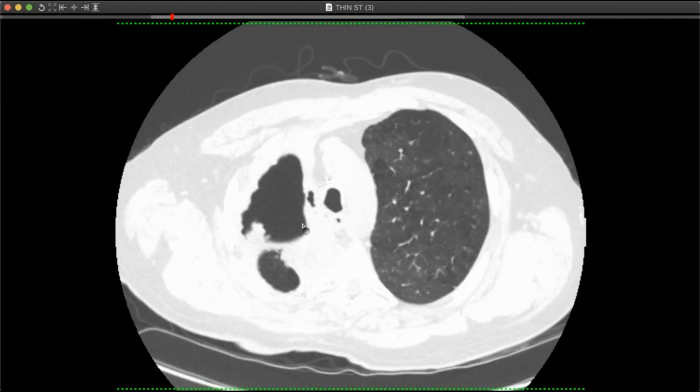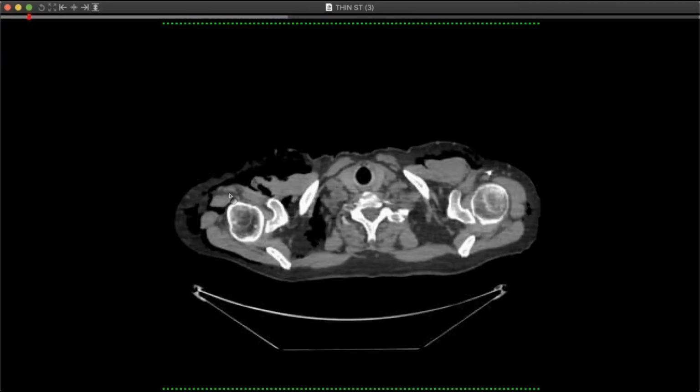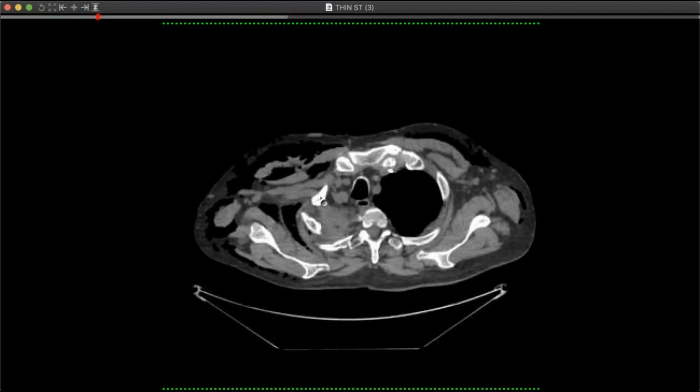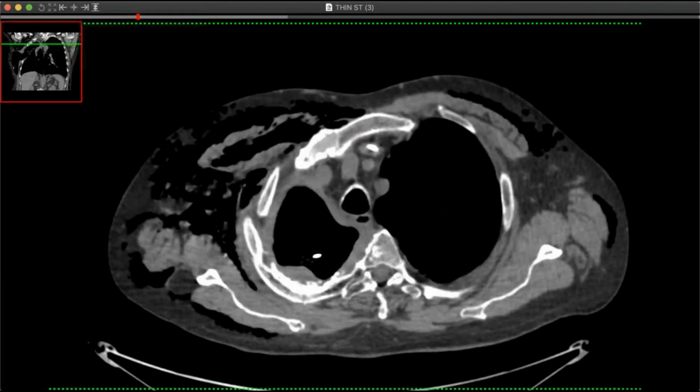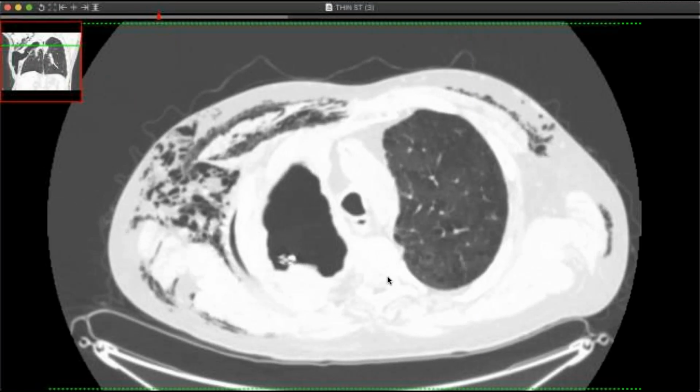So they put a latissimus flap in, and here is a radiograph where you can see the muscle flap here. I tried to get the more recent radiograph, but I'm having export issues on that particular file, so I'm going to try a couple other things before I send it along. But what's really cool, the patient was having more gas leaking into the chest wall. You can see there's a drain in here. So the presumption is this flap wasn't doing what it's supposed to be doing.